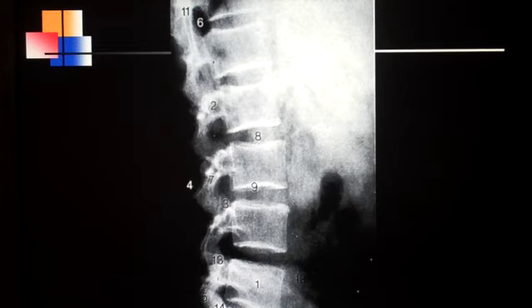Now, not numbered, but you see the diaphragm coming down right here. And of course, on the lateral view, that is called a posterior costophrenic sulcus. Posterior costophrenic sulcus, lowest point of the chest cavity, first to fill up with fluid if you have some disease process such as pneumonia or cancer that causes fluid in the lung field. And so we would look at this spot just to make sure that there is not a fluid line in the posterior costophrenic sulcus. This ends this video.